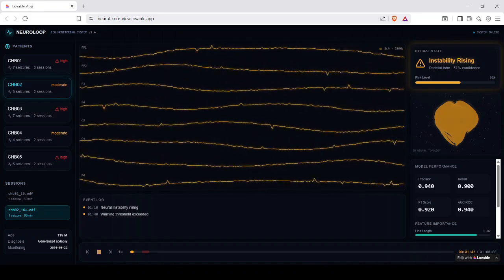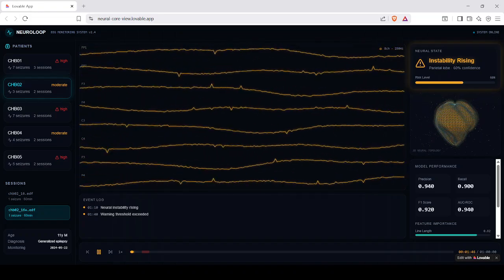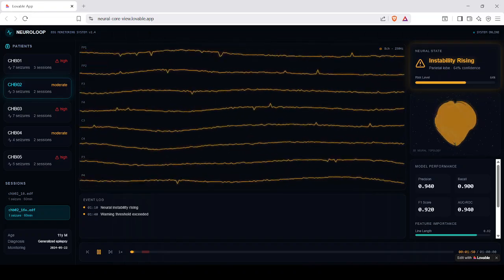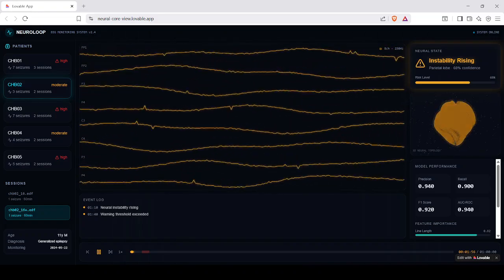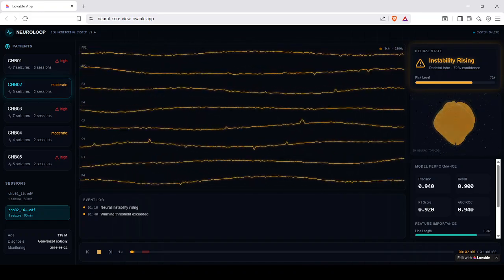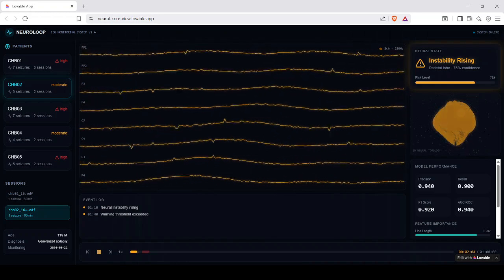The platform simulates multiple patient EEG sessions, each with a unique waveform, behavior, and seizure history. Users can switch between patients and replay recorded monitoring sessions. At the center of the dashboard is an 8-channel EEG waveform engine continuously animating neural activity across multiple electrodes.